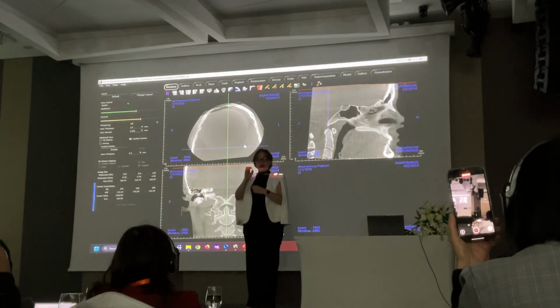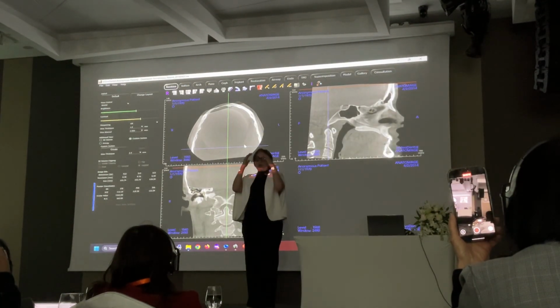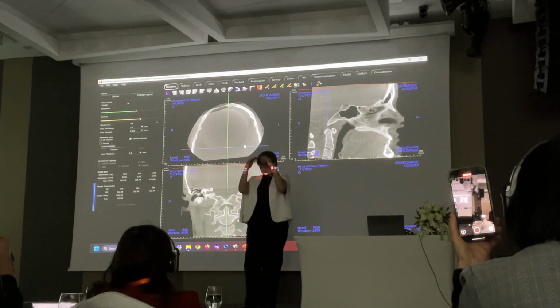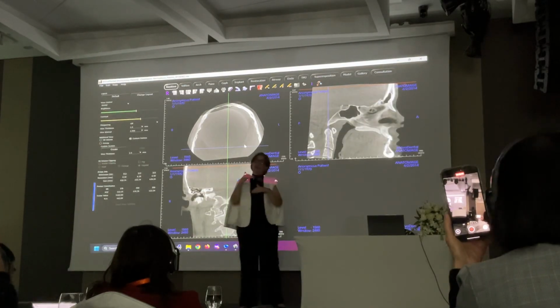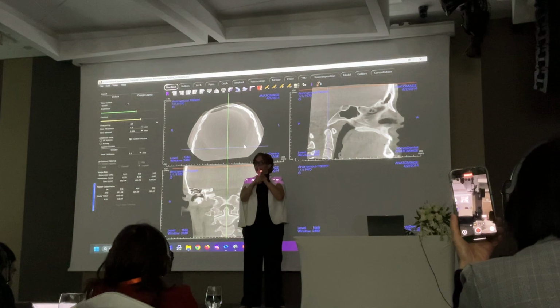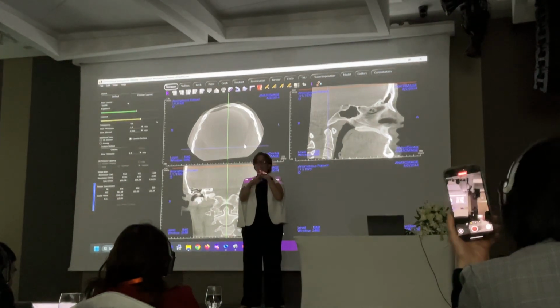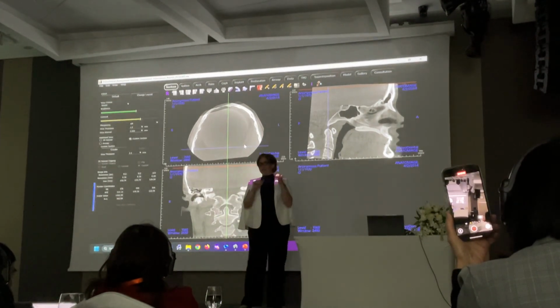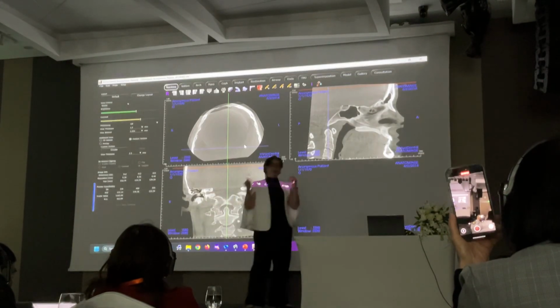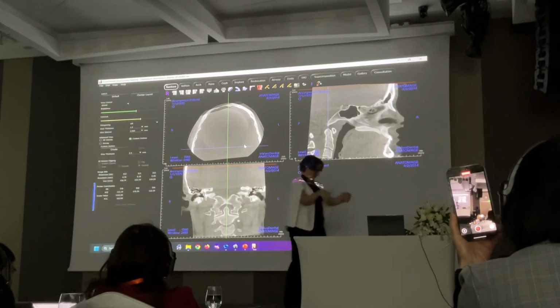When you're done with all of this, you are going to quickly go through the gray things, which are the soft tissue, okay? So one density at a time, gray things, and then after all that is done, you look at maxilla, you look at mandible, and then you look at teeth. And then you look at the thing that you care about. You see, the thing that you care about is the last thing, so that you don't miss anything. So now here we go.